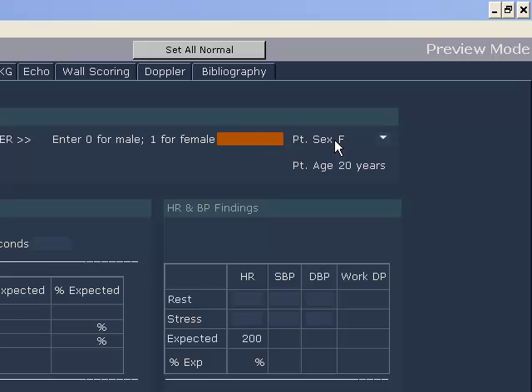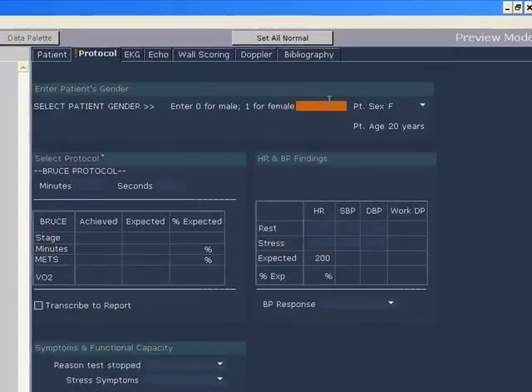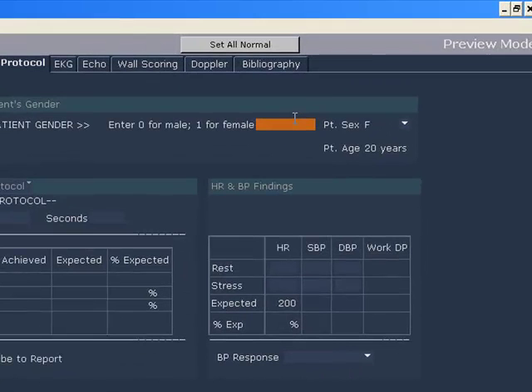Unfortunately, letters M and F cannot be used at present stage in calculation, so they have to be converted into a numeric value. Since this is a female, you place a 1 for female; had she been a male, that would have been a 0 for a male in this field.